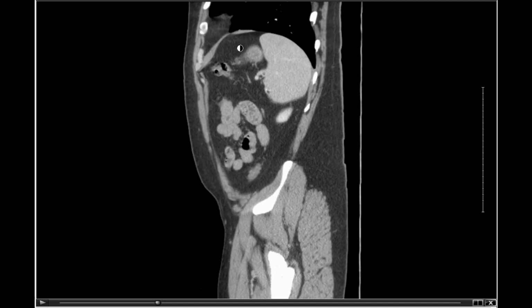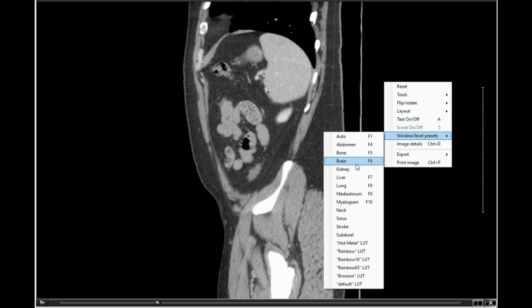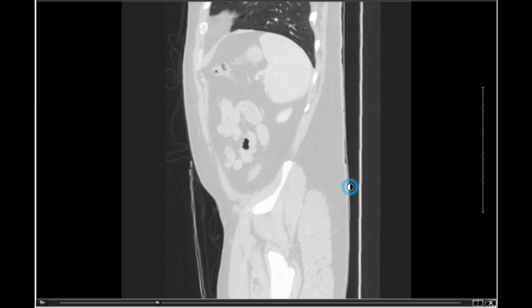And here, I'm starting to get a nice division evident between the abdomen and the thorax. We can see the diaphragm right here, and I'm really briefly going to mess with the levels. We'll take a look at the lung setting. And right here, everything in the abdomen's washed out a bit, but check out the lungs.